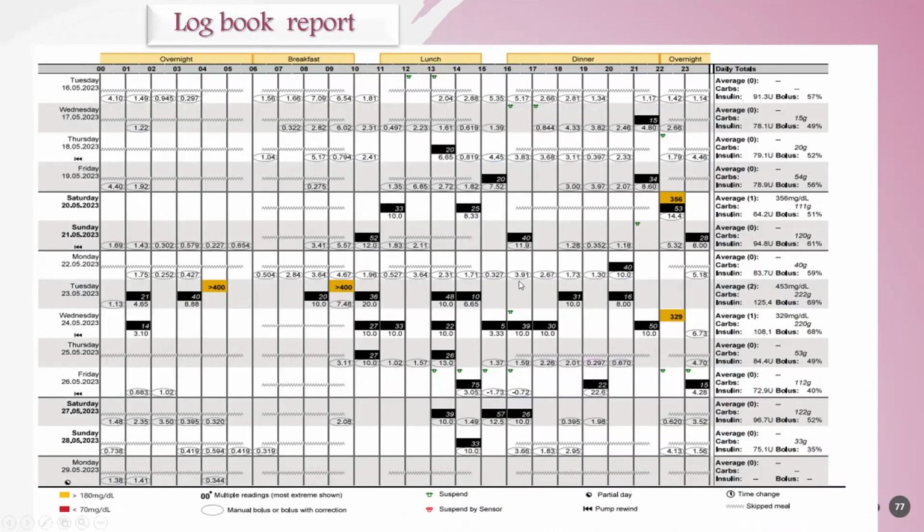Okay, and you will find again segments. To test the carb, you want to find the segment where there is carb intake, and after it there is a blood sugar, like this segment. But it was only 1 hour after he took the carb, and he did not enter the blood sugar. So it's very difficult to tackle and to say what he has here. Blood sugar is high, he gave 14 units. We don't know what happened after.